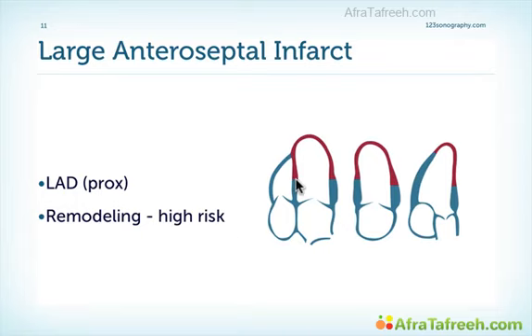And we have involvement of the entire apex, including mid portions of the anterior septum, sometimes even further down, also involving the inferior septum. Then we have involvement also of the mid-anterior segment, sometimes even of the mid-inferior segment, especially if the LAD goes all around the apex. And we have involvement of large portions of the anterior septum, as already mentioned, sometimes even further down all the way to the basal septum.